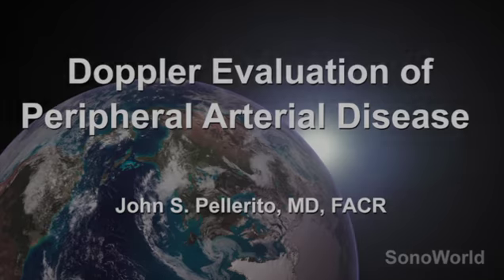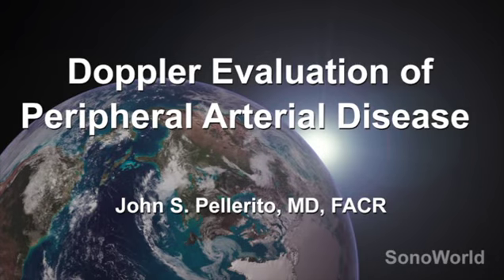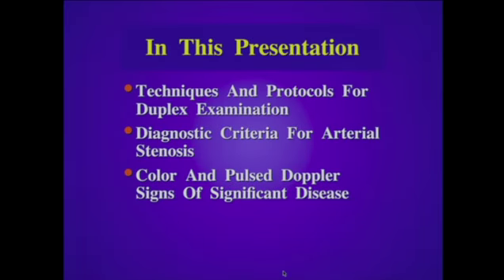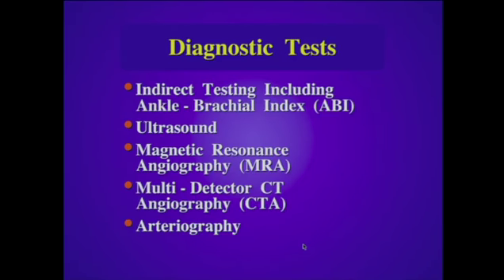I will be discussing the Doppler evaluation of peripheral arterial disease. In this presentation, I will review the techniques and protocols for the duplex examination of the peripheral arteries. We will review the diagnostic criteria for arterial stenosis and review color and pulse Doppler signs of significant peripheral arterial disease. Now, there are multiple diagnostic tests that can be employed in the evaluation of the peripheral arteries.